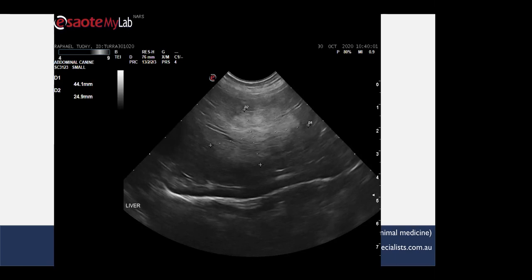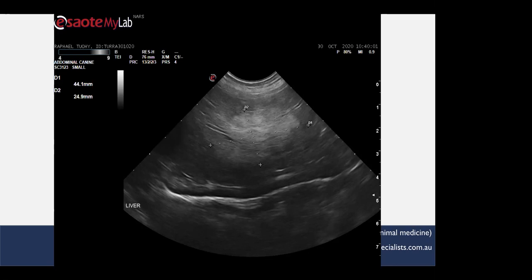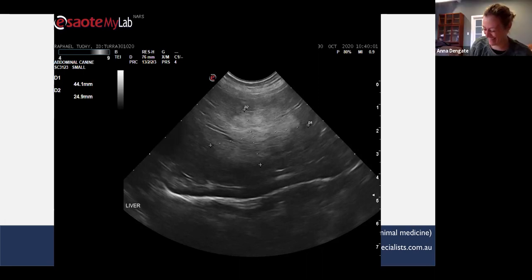Okay. If you had nodular hyperplasia, would you see the vessels attenuate like that, or would you still just get the vessels traveling through it? Do you know what? Nodular hyperplasia is on the list of every single possible appearance of a nodular lesion in the liver. So yes and no. Always have it on the list, particularly the people sitting membership exams. Nodular hyperplasia is on the list no matter what it looks like, except anechoic. Nodular hyperplasia is never anechoic.